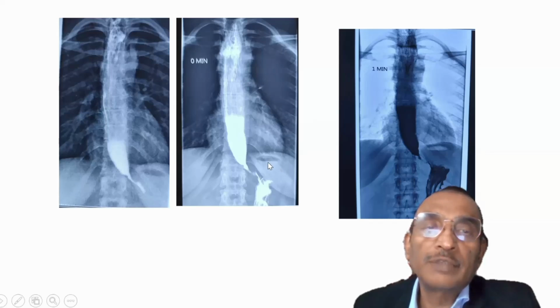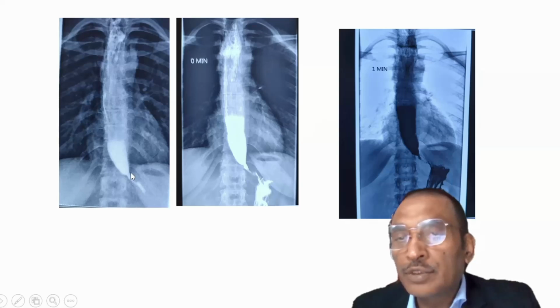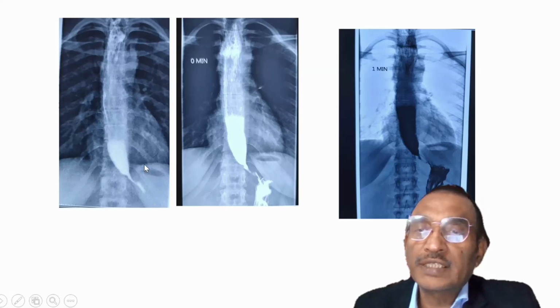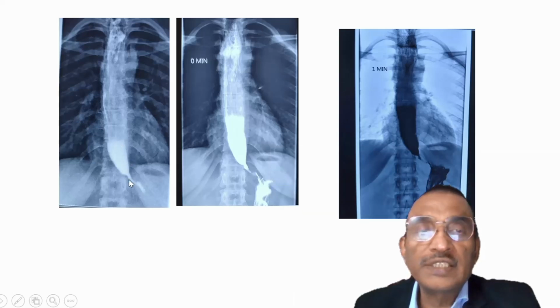So it is not in 100% of the patients, or this study might have been done after intervention or balloon dilatation. And in this stricture, there should be no mucosal destruction. The mucosa appears pretty smooth out here. But there is always the differential diagnosis of secondary achalasia. Most of the time, secondary achalasia tends to go above the dome of the diaphragm, and there will be evidence of mucosal destruction in this segment.